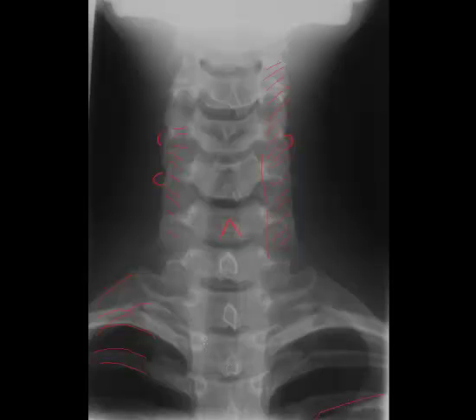Now, in terms of soft tissue structures, we have to account for the tracheal air shadow. If you look closely, there's this more lucent area that's usually visualized in the midline of the spine if the patient's not rotated. This air column is the tracheal air shadow. This should be midline. Lastly, we need to assess the lung apices.